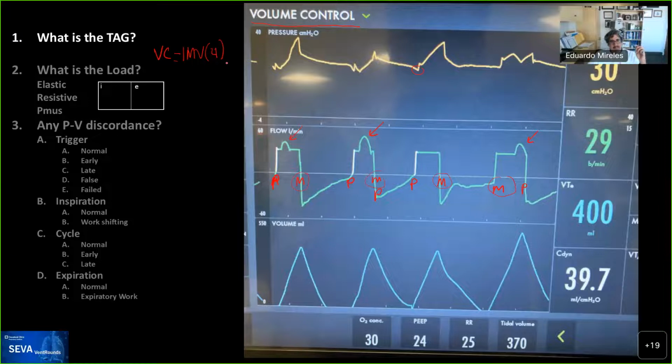And the importance of this, I mean, there are several items to think about. The first one is, if you realize the inspiratory time for this breath is longer and this one is shorter, because the way that the ventilator is programmed is that when the patient gets the tidal volume that is set, as you can see here, and the patient effort ends, the breath is going to become shorter to ensure that the patient gets the target tidal volume. But if the patient makes a lot of effort, they will be able to get actually a larger tidal volume than what you set. So these are nuances that I would say you need to recognize on these modes as you're going through.